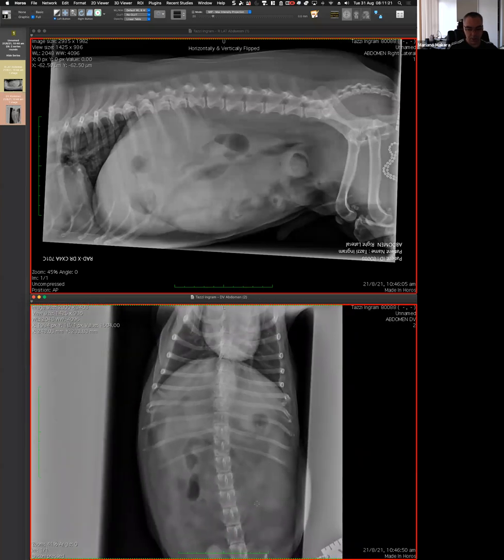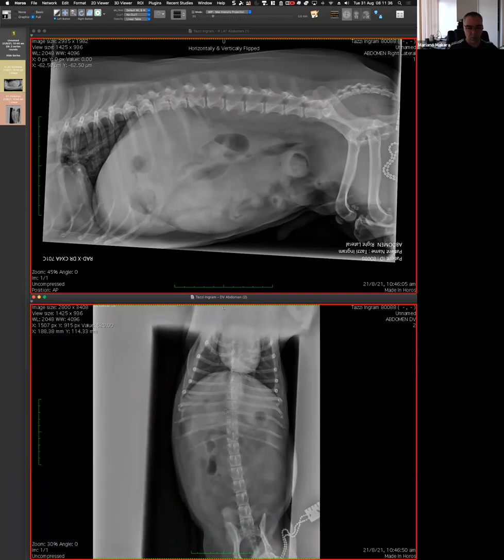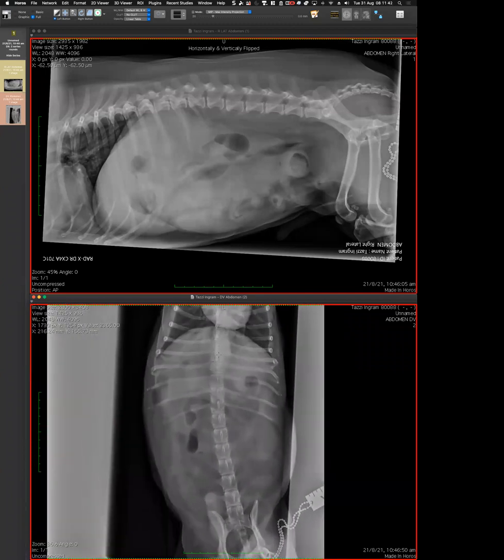The other one is the left kidney that is more caudal compared to the right. So I think the border of the right is there. The border of the left is there. So the spleen should be on the left, caudal vena cava on the right. I think that's the fundus of the stomach. So once I find all of that, I can confidently say, you put the marker wrong. Okay.